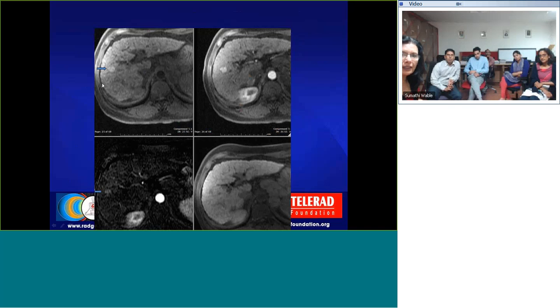What about this one here? There is a nodule which is brighter than the rest of the liver even before we give contrast. Now, did it get any brighter? This is where you have to do subtraction, right? Subtraction is great as long as the patient takes a breath the same way and there is no misregistration. When you do subtractions, you have to make sure that it is really the same slice you're subtracting.